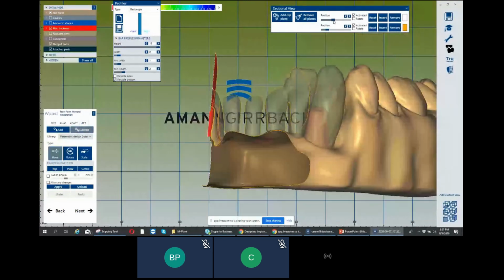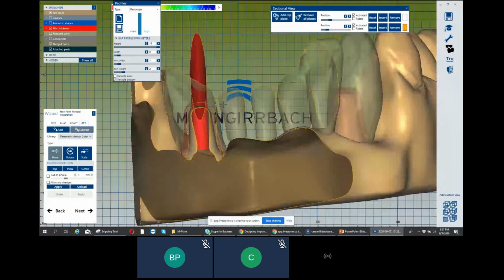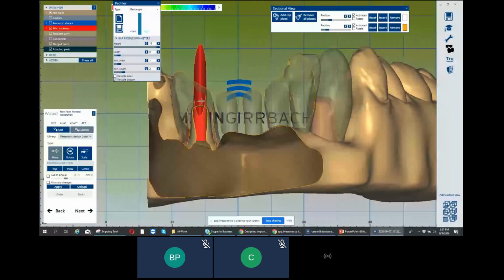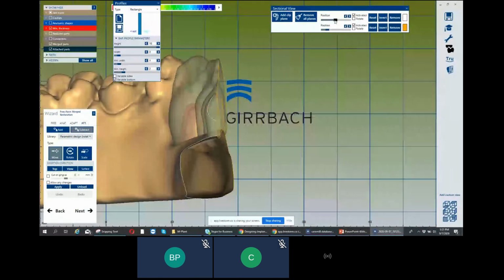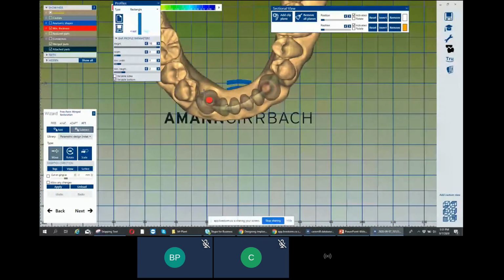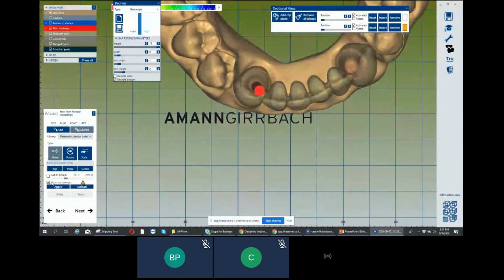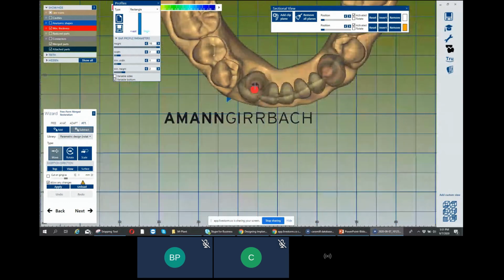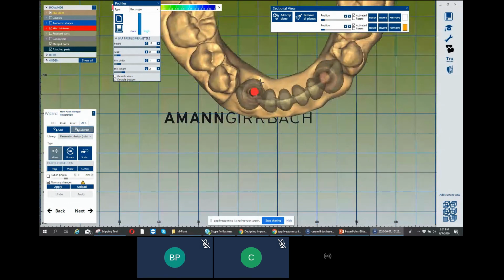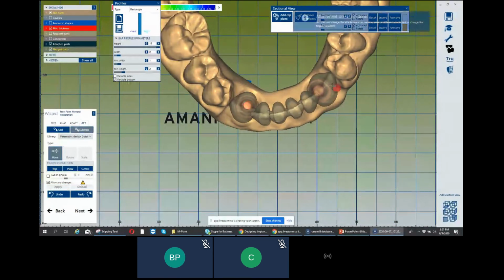So here also you can check. This is in the middle of your crown. Perfect. On the other side, this is in the middle of your crown. Like this. You have to apply, but before you click on apply, you click on allow any changes, so you can cut through this part. Okay, apply. Same for the second one.